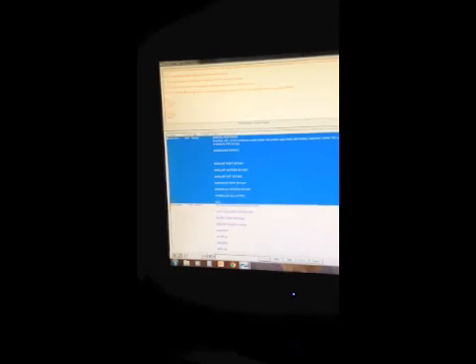The accretions assessment is one where you have to delete what is not relevant to your patient. So if your patient has moderate accretions, you would delete the other classifications that don't apply, leaving you with just what applies to your patient for your generalized findings.